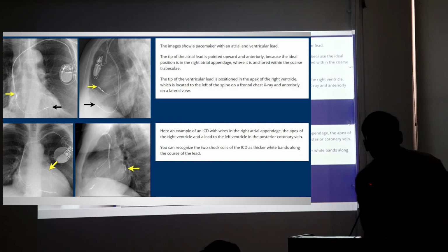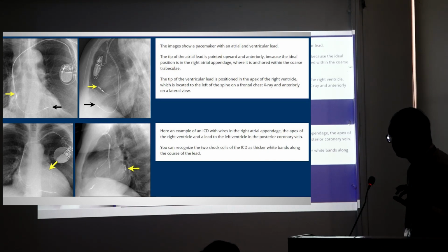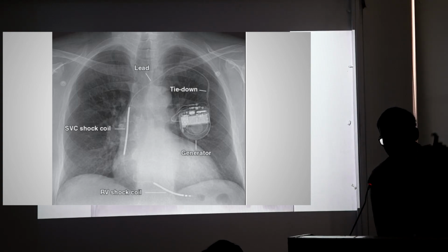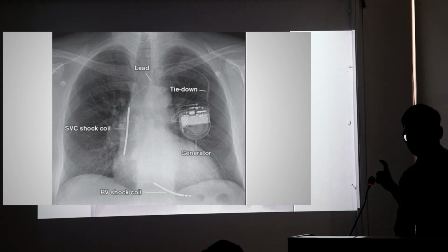Now this is pacemakers, permanent pacemakers and implantable cardioverter defibrillators, ICDs. Okay. Can you please tell me how to differentiate between the two? ICDs have got a shock coil. There are more opaque lines you can see. Can you make out? These will be there only in the ICDs, not in the permanent pacemaker. So that's how you can radiologically make out. And the generators will be bigger in size, although the new generations are becoming a bit smaller. But really, if you compare the size of the permanent pacemaker generators and ICDs, the machines are a bit bigger for ICDs.